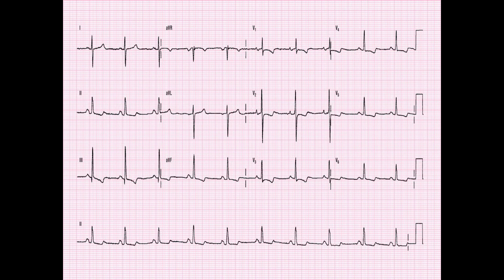All right, let's look at a couple of 12 leads and go through our process. The rhythm itself is normal sinus rhythm. We have a nice P wave. Axis: let's look at lead 1 and AVF. AVF is definitely upright, definitely positive. Lead 1, is that positive or negative? We have to put a tag on it. Do you think it's more positive or more negative? If we were to measure that and take out your handy dandy calipers that you bought, it's definitely a little bit more negative than it is positive.